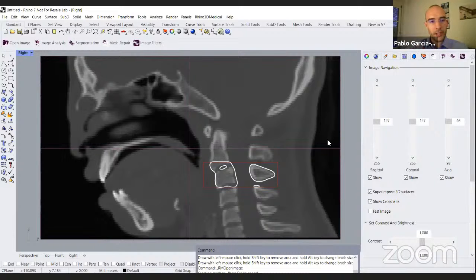But what we don't offer is a neural network giving you segmentation. What we offer is a scripting library that you can use on your data to automate very specific tasks. This is what Grasshopper does, no? The scripting. Sure. So you can automate tasks by programming your project with it.